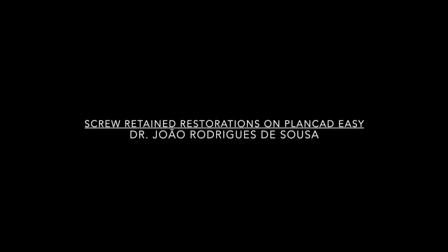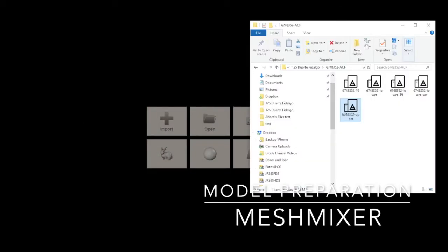Hi guys, I decided to do this video because most of the time when we're using PlanCAD Easy, we're doing cement retained restorations. So I had the need myself to create screw retained restorations and find an easy way to do it on PlanCAD Easy.